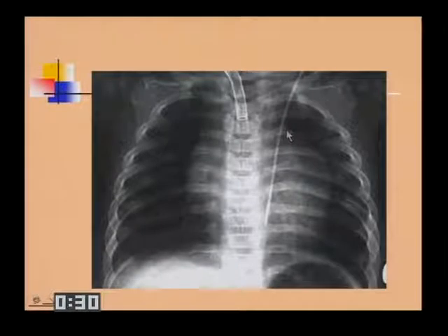It's seen in about 10% of patients who have tetralogy of Fallot. So if you saw this, for example, in association with a child that had diminished blood supply or a right aortic arch, you would again be moving towards a diagnosis.